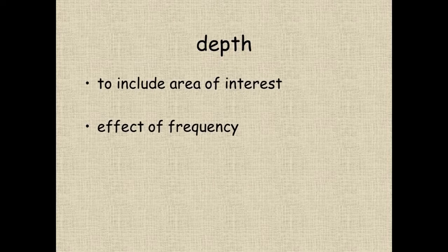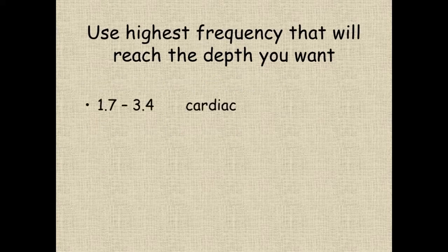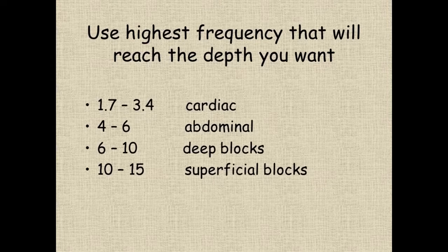The depth setting you select when setting up your ultrasound machine should include the area of anatomical interest and should consider the effective frequency. The general principle is to use the highest frequency you possibly can that will still reach the depth that you want to interrogate. Generally, in medical ultrasound, these are the sort of frequencies in megahertz that are used for different applications.